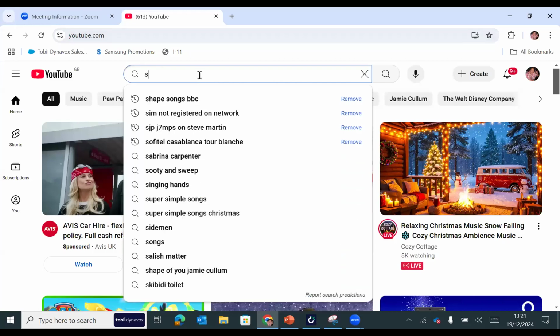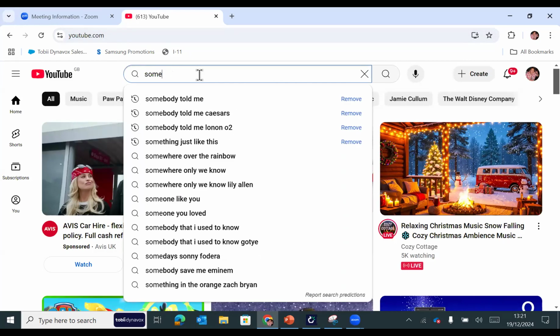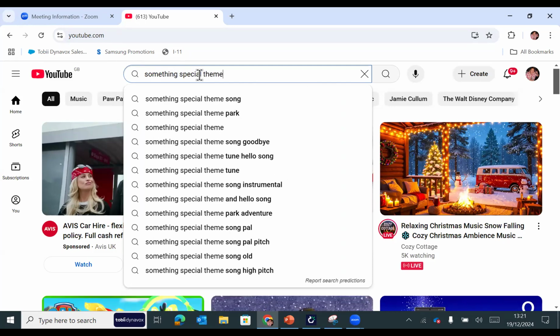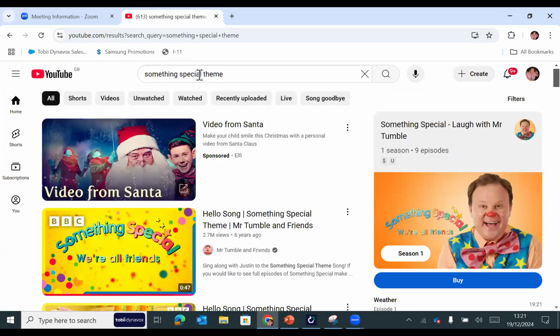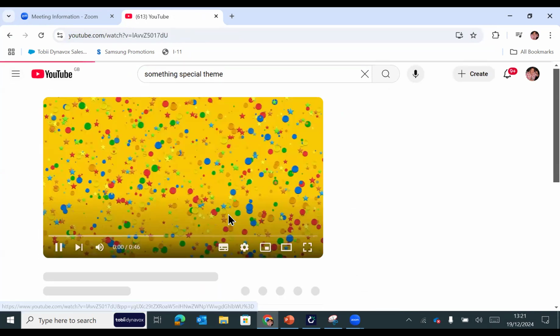I know some kids like something special, if I can spell it. Something special theme. Okay, so I can check this video.